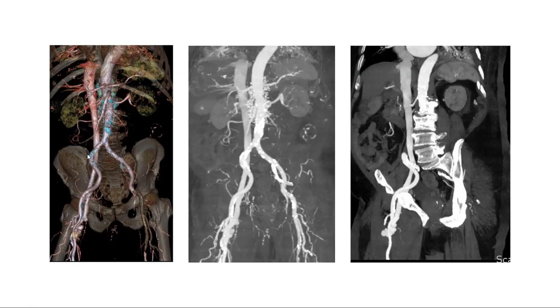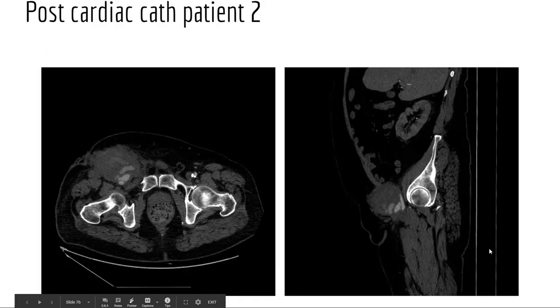post-intervention. These are beautiful 3D rendering and 2D MIP images showing this early femoral venous filling and filling of the IVC. So this patient would need intervention. Cardiac, sorry, cardiologist. Let's just say post-intervention patient. Whoops. Patient with a growing right inguinal mass following a procedure. A nice little pseudoaneurysm here.